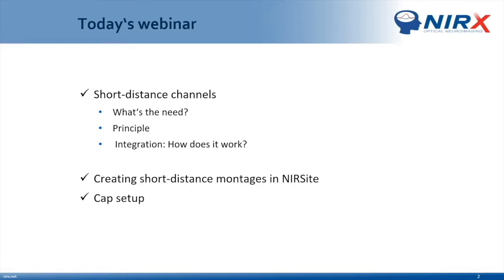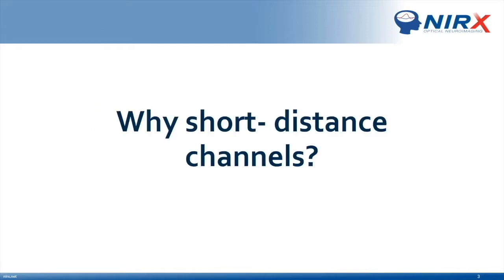From the hardware side, we'll see how to place short detector probes on the cap. And once we have our hardware ready, we'll then move on to set up data acquisition with short channels in NIRStar 15.2. This webinar will not cover the data analysis of short channels. This part still has to be streamlined, and this will probably be a topic somewhere in the future. But lastly, we will have some time for any questions you may have.